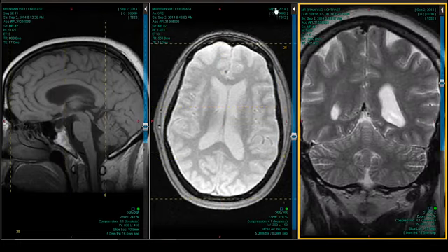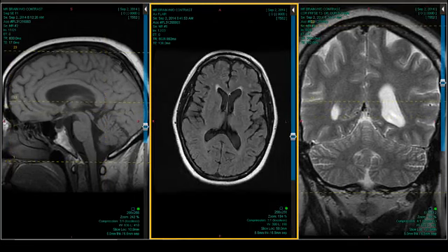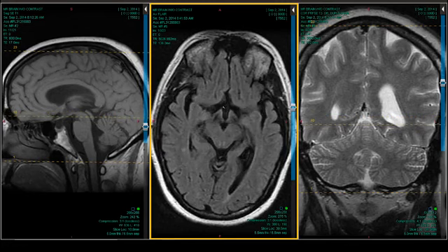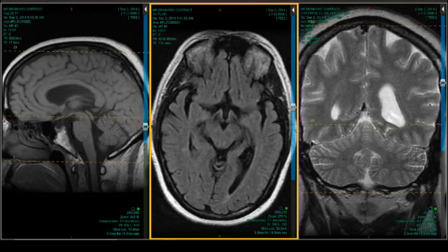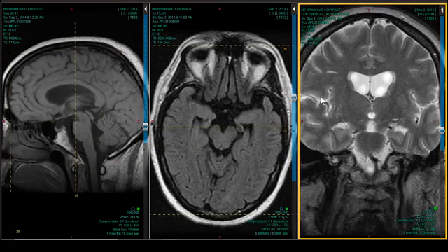And I'm also underwhelmed by the amount of vascular disease. So this is one where I would consider either ALZ or maybe even a variant of Pick's. It's got some frontal predilection here, especially across the orbitofrontal region, and it's a little worse on the left than right. So I'd be wondering about one of these Broca type Pick's disease. So I'd probably be choosing those two. Would be my top two choices. Right. What do we know?